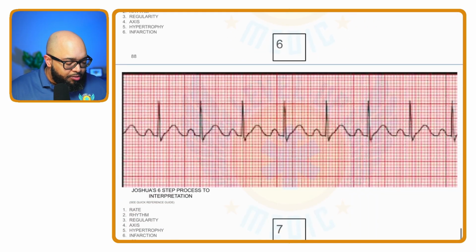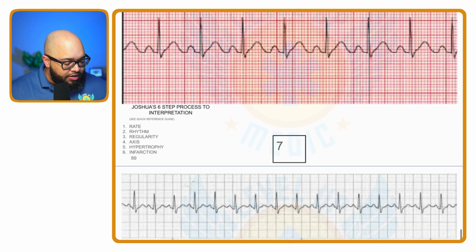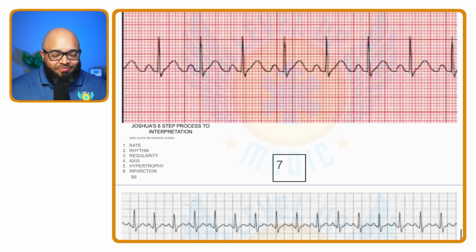I'm going to go ahead and skip number 5. I want you to figure out that on your own.